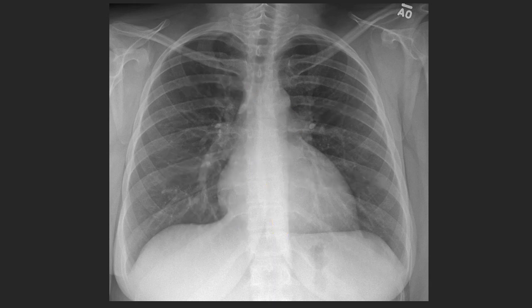Two additional lines that you may see on the frontal radiograph are the junction lines. There's the posterior junction line, which is more superiorly located, and the anterior junction line, which is more inferiorly located. These represent areas where the lungs contact each other both posteriorly and anteriorly. Another way of thinking about these lines is that they represent 4 layers of pleura.